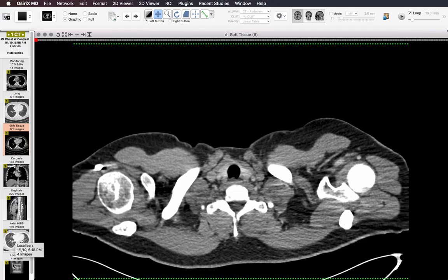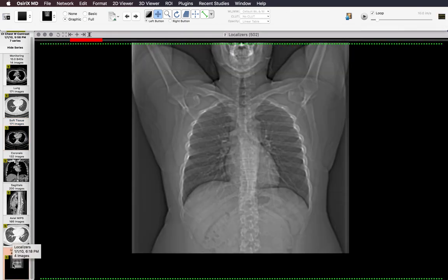All right, now the first thing that I look at before I even look at the CT is the scout image. The reason is a lot of times the scout image covers more than you'll see on the axial images. So you might pick up something in the abdomen or in the neck on the scout that you won't see on the axial chest CT images. So it's very important to look at the scout image on every patient.